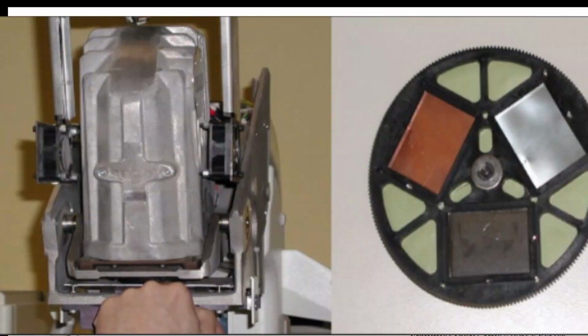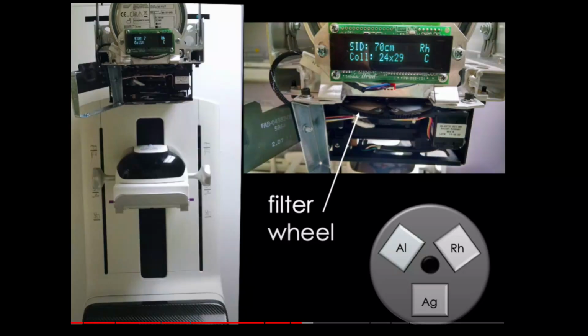Here we see the filter wheel that is utilized in a mammography system so that we can select the different types of filters. You can see how using the filter wheel we're able to select the type of filter we want to use in conjunction with our anode.